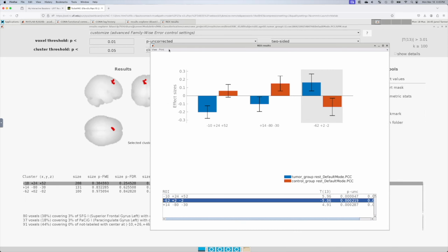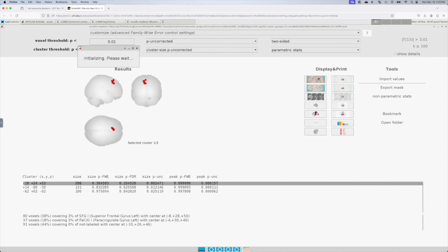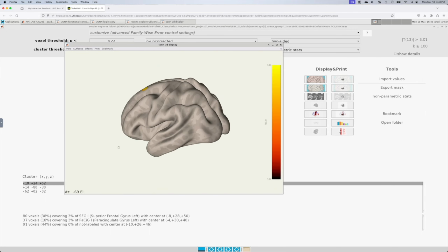And so here's a way to look at it. So for homework, what you can do is something like this, and then you could get a pretty picture to display. You could either do this screen, which would be sufficient, or you can open up a different image like this. It'll just take a few more seconds, and you can make this window bigger and rotate this around.